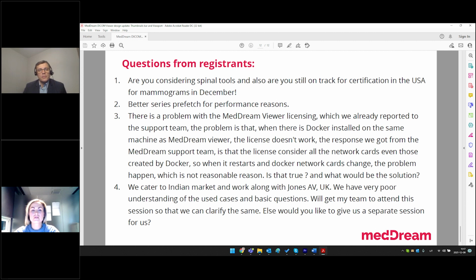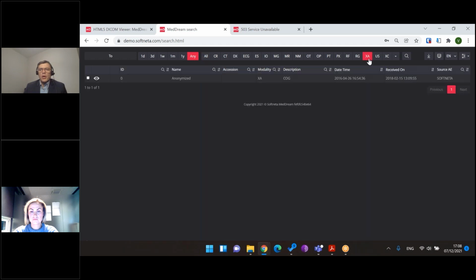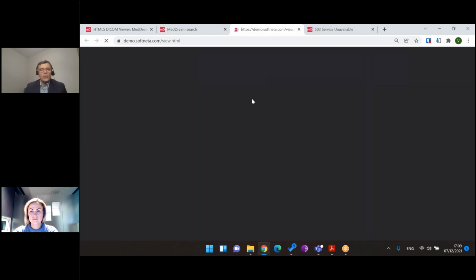Okay, thank you, Vytautas. We have 4 questions, but I'm going to read the questions from during the session first. We have some clients who ask about the possibility of making angiography diagnosis. Does the MedDream viewer support that? Yes, so angiography is supported, and you could do measurements, you could invert angiography, and I could even show a small presentation of it. Now I'm selecting angiography from our web page, so you could also go to the same web page.